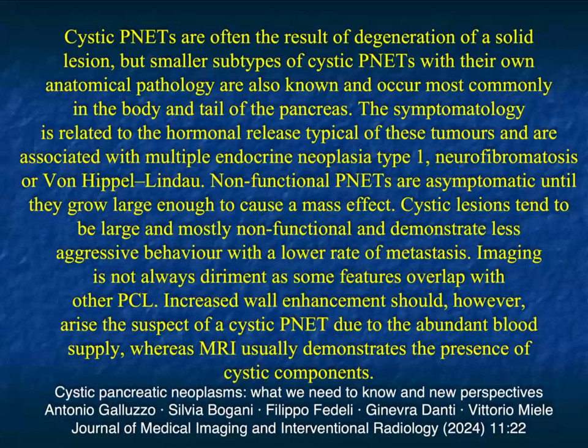When we talk about cystic pancreatic lesions, one of the things that's often left off, but we do see it frequently and it can be confusing, are cystic neuroendocrine tumors. Most neuroendocrine tumors are hypervascular, usually seen better on arterial and venous phase imaging, but I showed you a few variants of that. You can see these neuroendocrine tumors with certain syndromes like MEN type 1, neurofibromatosis or von Hippel-Lindau. What's interesting is they look at times almost identical to an IPMN.